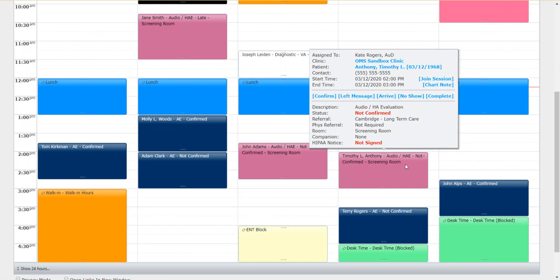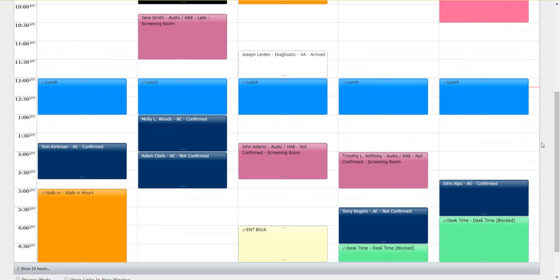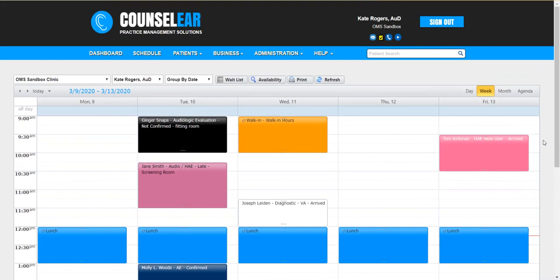Okay. Now, of course, if things aren't working out, maybe the patient doesn't see the email, or it went to spam, or they're confused in some way, once again, you can always fall back on the on-demand. So the scheduling can be really convenient and will probably work well most of the time. But if you ever need to, you simply say, you know what, I'm just going to shoot you an email right now. And you go right through this process and you fire it up and there we go.